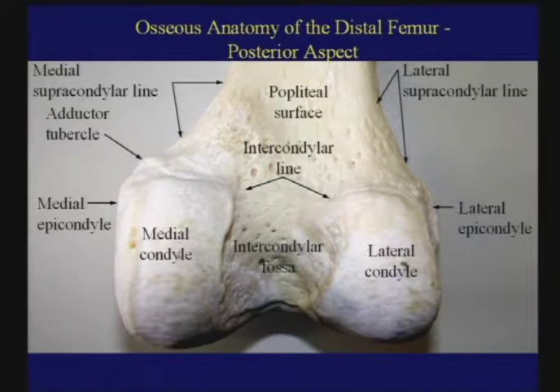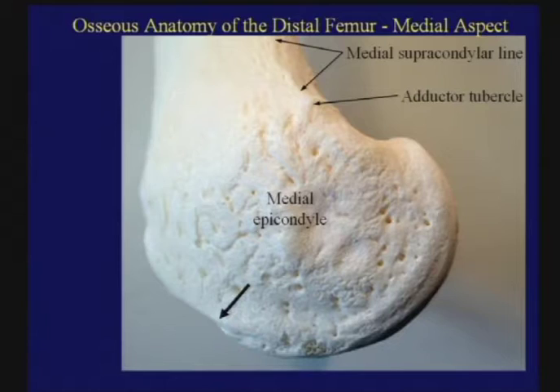This is an important landmark that we see on MR and CT images, and Minnie tomorrow, when she discusses the medial supporting structures of the knee, will certainly concentrate on all those things that attach to the tubercle or around the tubercle. It's a very, very crowded area of the knee.